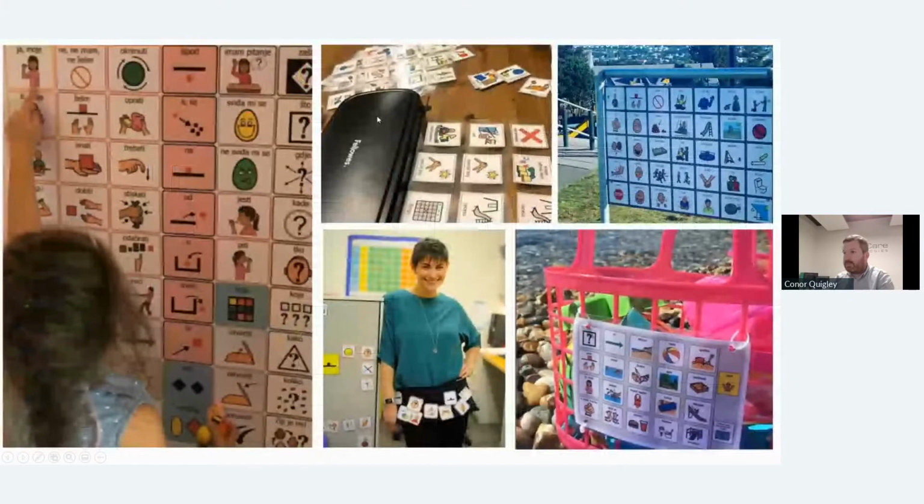And then if we look, this is just some images that have been taken from users around the world. So you'll see, in different languages, obviously they've been localized. So in a classroom, you might have a communication board up on the wall. You may be printing and laminating your symbols to help somebody in assistive communication. These on the right here are communication boards in playgrounds and school yards. We're seeing these more and more in Ireland, actually.